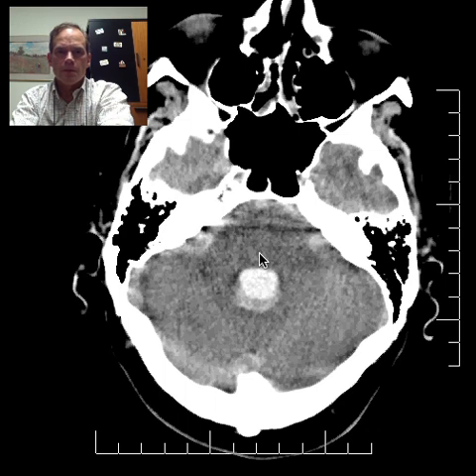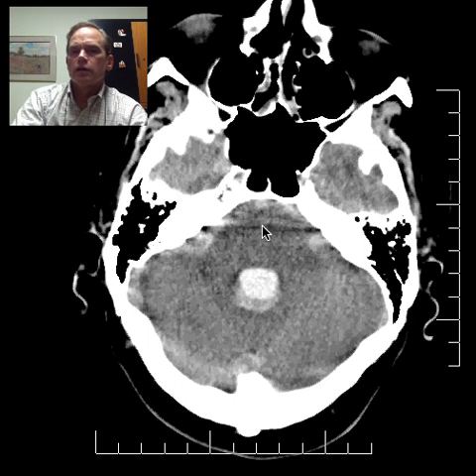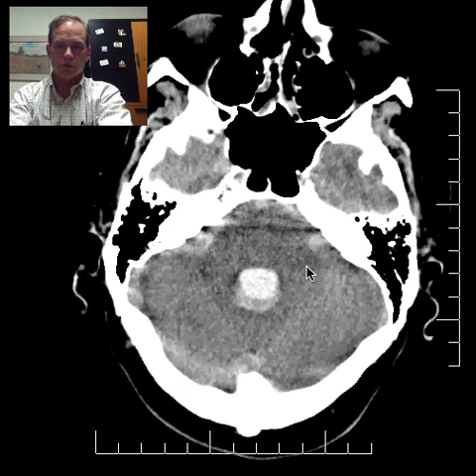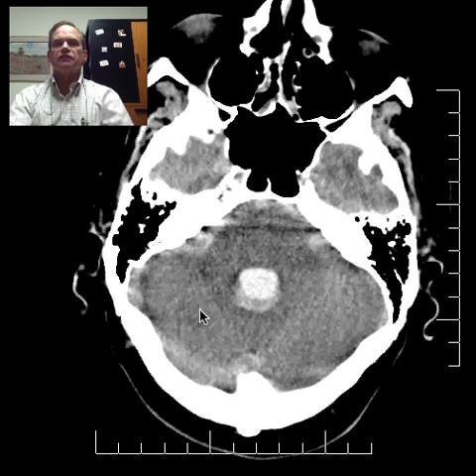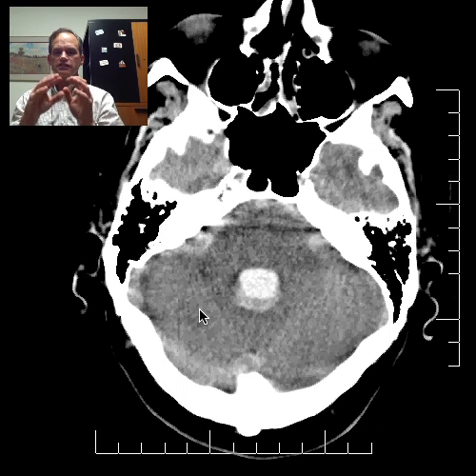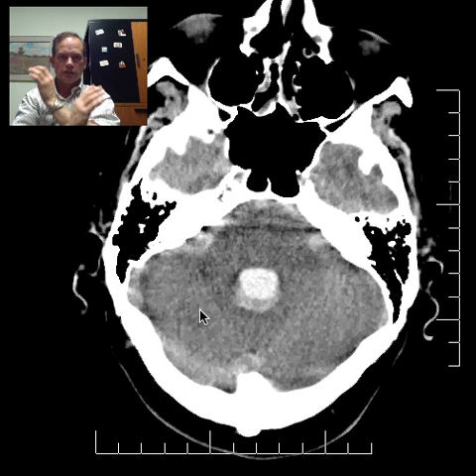And this is the pons. And this bridge here, this connection from the cerebellum to the pons, is the middle cerebellar peduncle. There is, of course, a superior and an inferior, but this far and away has the great majority of fibers, and these are the fibers which are crossing to compensate for the fact that the cerebellum represents things ipsilaterally, and the cerebral hemisphere represents things contralaterally.